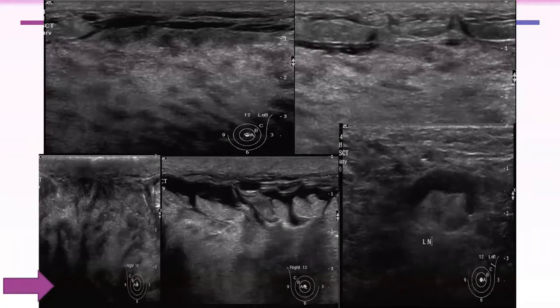This here, these are lymphatics. The skin is thickened, and below the skin, these are subcutaneous vessels, subcutaneous lymphatics. So the subcutaneous lymphatics are dilated, also engorged. And below which, what are these?